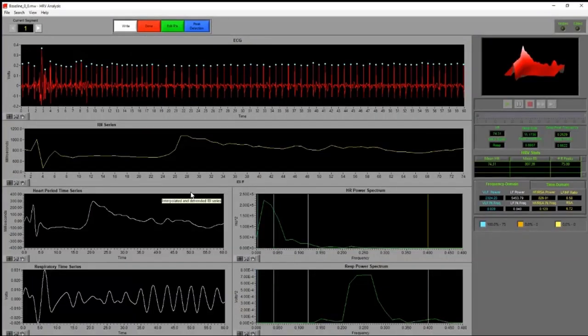Okay, so I'm going to briefly describe all of the different windows, these different little portals that we have, how we use them to inform our edits, and how we also use them to validate the information to make sure that it's good integrity. So the first window we have here, as you can see with the title, is the actual ECG plot. Nothing too fancy here, except that our algorithms have gone through and tried to identify the peak, some sort of singular fiducial marker on every beat that we can then use to compare to the next beat.